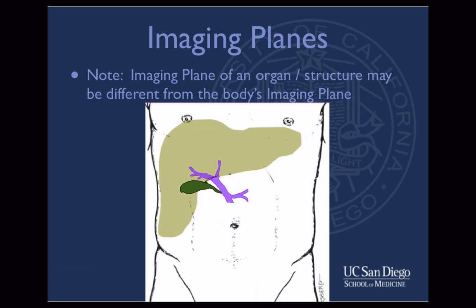In the diagram above, the portal vein is demonstrated draining into the liver. Note that if the probe is placed in a sagittal imaging axis, the portal vein would be visualized on the ultrasound machine in an oblique view. If the probe is rotated, however, the portal vein can be visualized in a longitudinal axis.